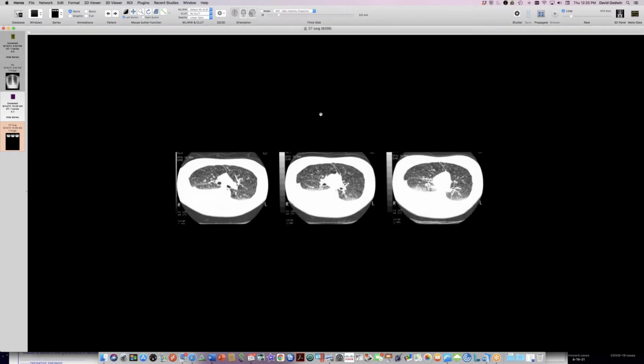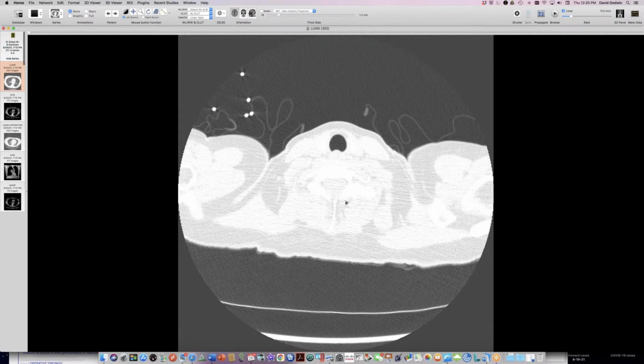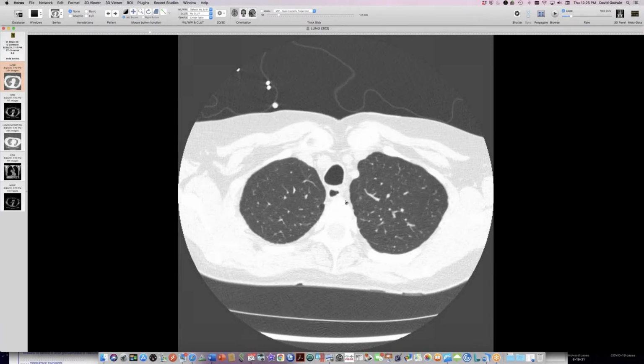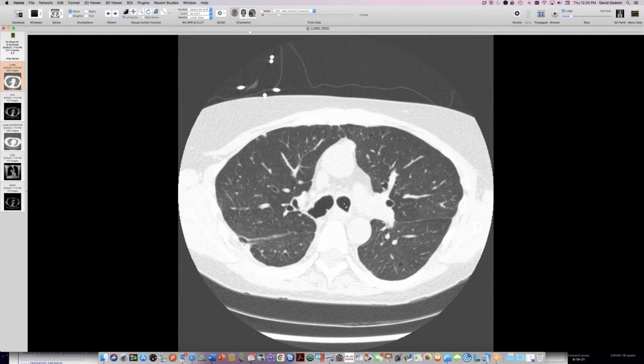She does have some cysts that you can see here in her lung bases. This is scanned CT on film. Some people may remember film. And she has bilateral pleural effusions, which are presumably chylous effusions at this point. So she was transplanted in the year 2000, and she's still being seen. She does have some manifestations of chronic rejection, and interestingly, she has some recurrent cysts in her lung.